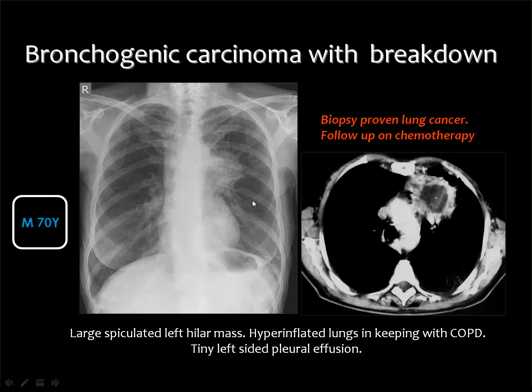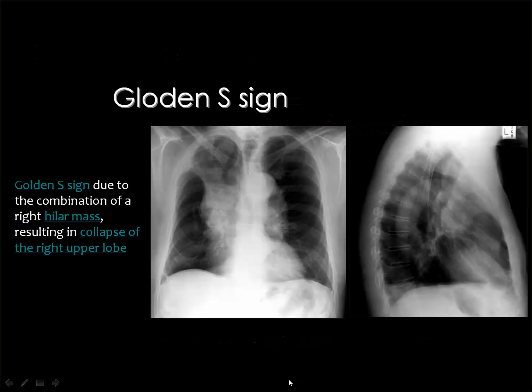Sometimes, whenever you go to the CT, for many reasons, of course, for confirming the nature of the lesion, for staging of the tumor, for using it as a guiding tool to have a biopsy, then you can see that the lesion is almost solid with a central area of breakdown.